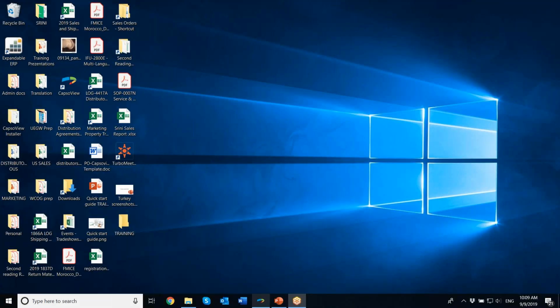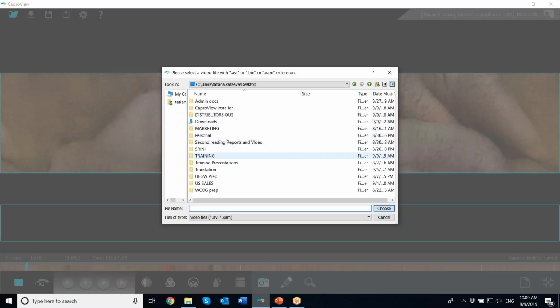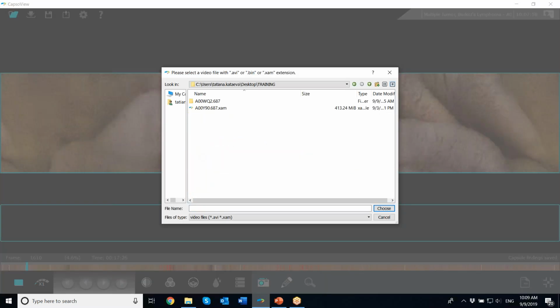Okay, let's open CapsoView. I already have an open study. However, I want you to see that to open the study, you should click Open Video here. And then I saved two videos in the two different formats. This format is XAM format.